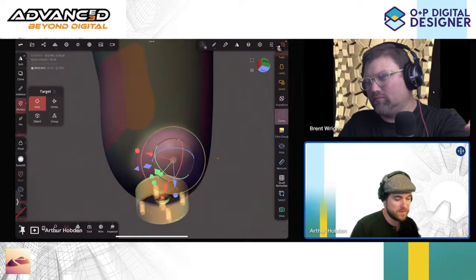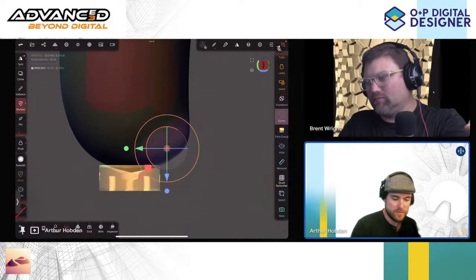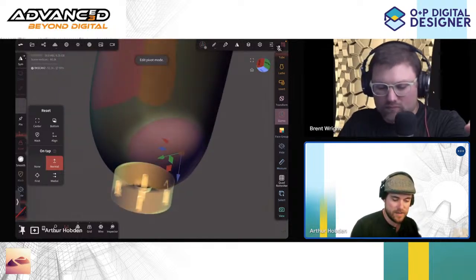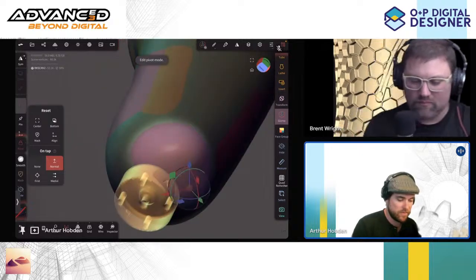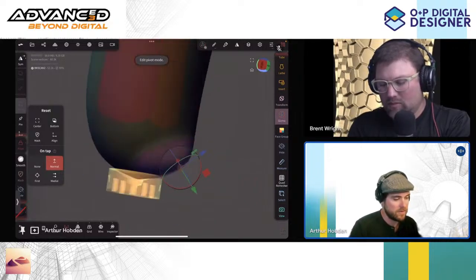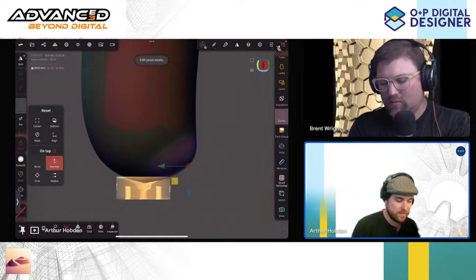I can move this mask with the gizmo tool, and if we want to move it to world space, we can, or we can actually align to normal of the surface on tap. So if I turn off the line, there we go. So I can actually choose that direction to move, something like that. If we're doing a reduction and going down, I think it might make sense to just stay aligned. If I do something like that.